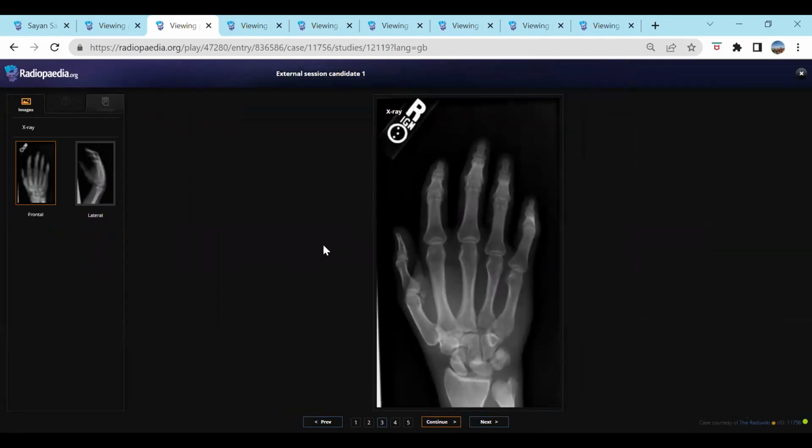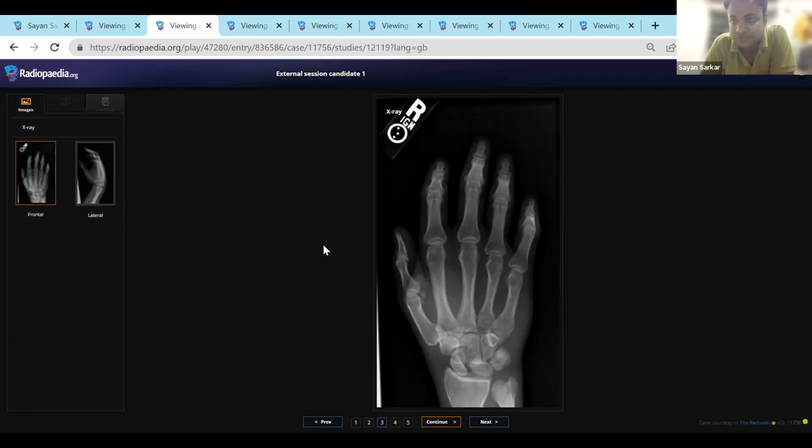Okay, yeah. So I'm provided with the right hand radiograph of an adult, slightly mature patient. I will give you a history because I'm trying to simulate the actual exam scenario as much as I can. So the history is the patient is a sports person who has recently come with an injury to the ER, and you're presented with this image. The ER has referred the patient for an X-ray, and you're the radiologist on duty.